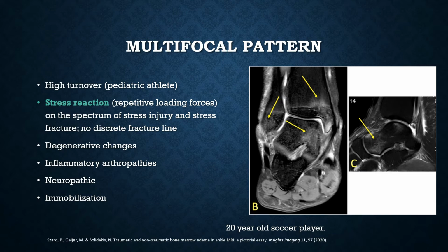A multifocal pattern of bone marrow edema we'll talk about both here under the trauma section and the non-traumatic section. There are many different causes for a multifocal pattern, and there may be more than one cause at once manifesting in an MRI that you're looking at.